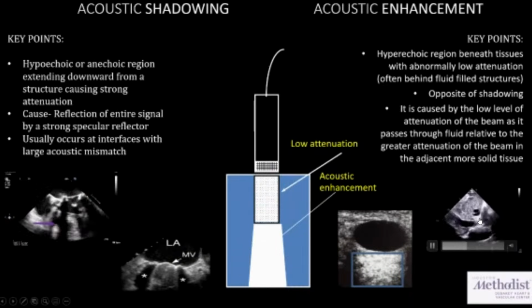If you see here, that's a fluid-filled cystic structure, and you see that acoustic enhancement beneath.